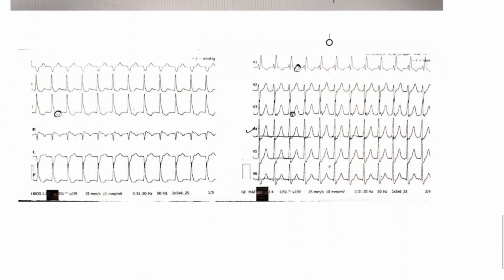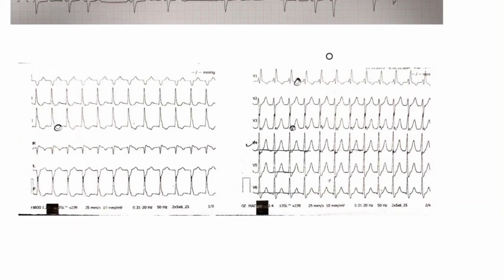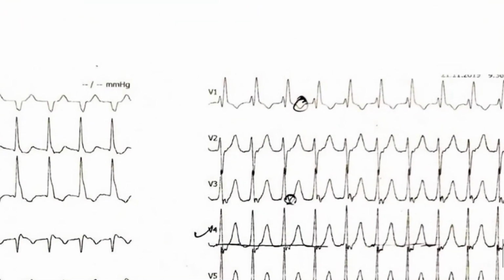The next ECG is going to be a supraventricular tachycardia, which was being aberrantly conducted downwards. And if you zoom in over here, you can see the very typical pattern of an R, S, and R prime wave with secondary repolarization abnormalities. This is very typical of a right bundle branch block.